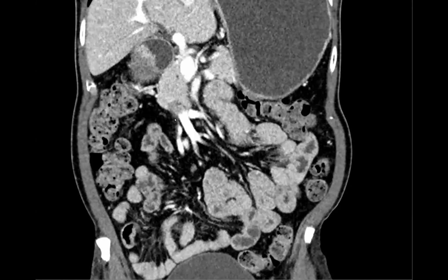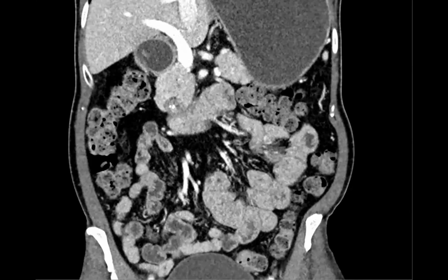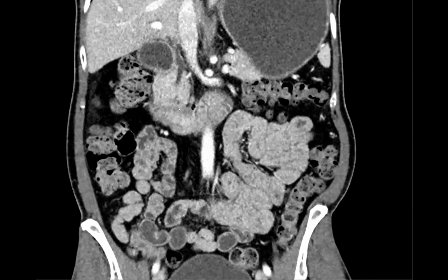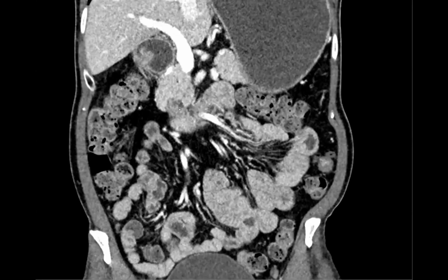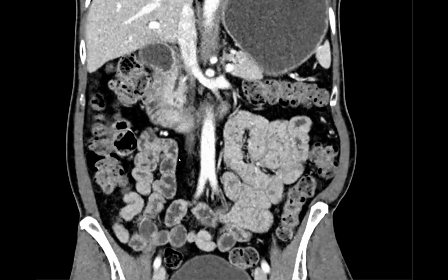So, all the different faces of adeno. One, we don't have the double duct sign because it's a low uncinate adeno. Two, statistically, when you're debating whether it's from the duodenum or pancreas, your money's actually on pancreas because it's more common than duodenal. Ultimately, you need to do an EGD and EUS and biopsy. Sometimes they still can't tell on just the FNA because it'll come back like pancreatic duodenal primary. But in this case, since the duodenal mucosa was smooth, they said it was coming from the uncinate process.